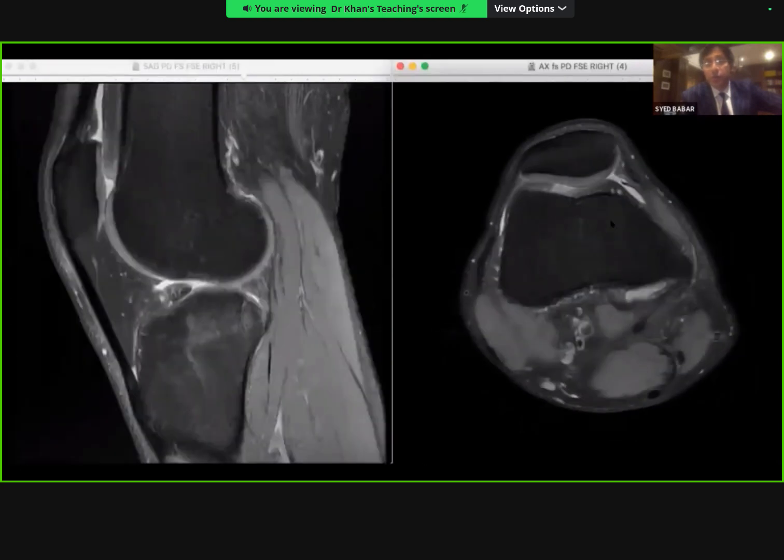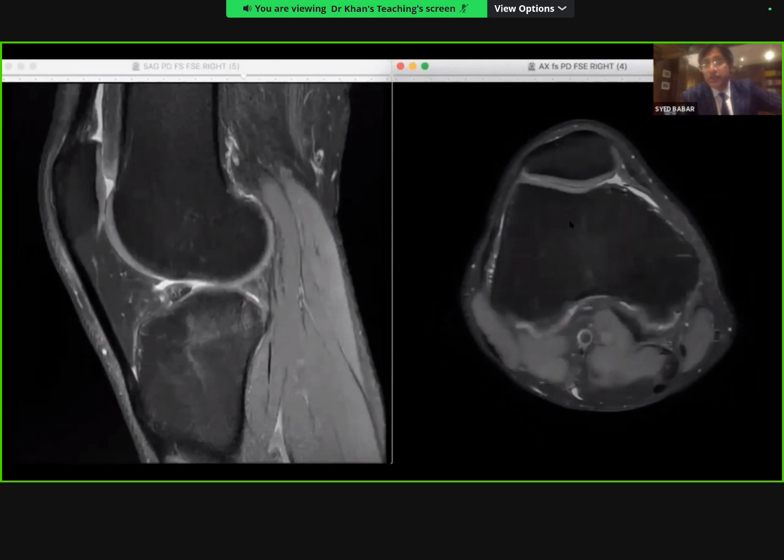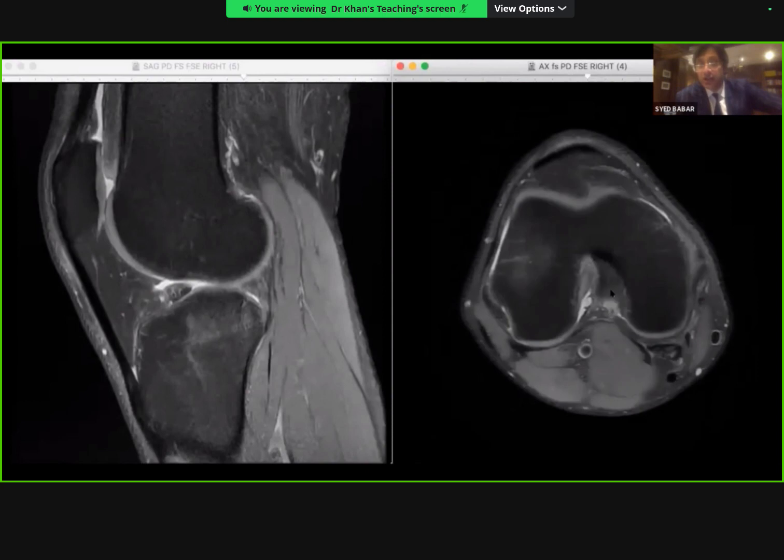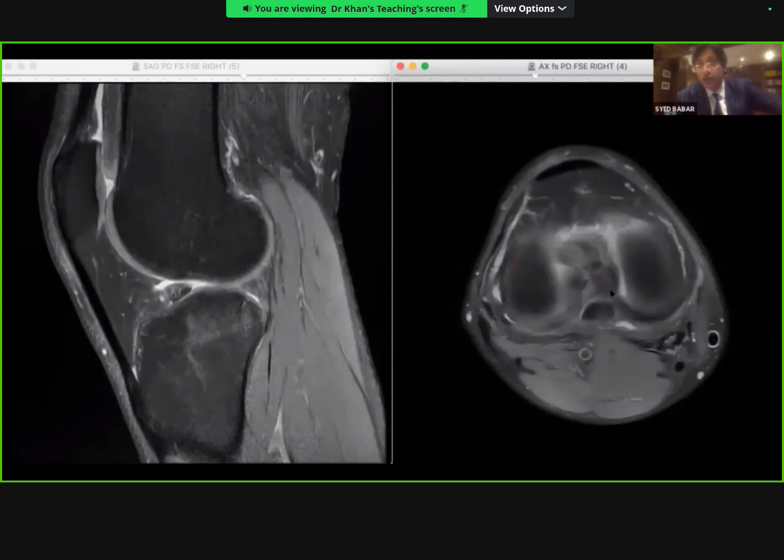So if I quickly run through it, I know we push for time, you can see the cartilage is nice and smooth, so there's no chondromalacia patellae change, but I can certainly confirm the femoral attachment of the MCL. So that's really gone, or in other words, not gone, but edematous. So that's damaged. You can see the ACL in there. You can see the PCL in there. It'll actually give you a lot of information. And this is where the problem is, which we think is probably an avulsion fracture.